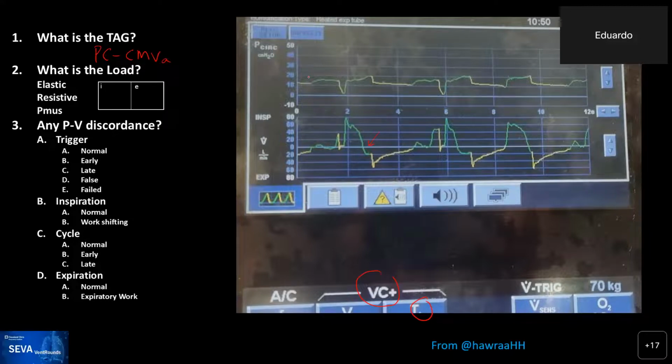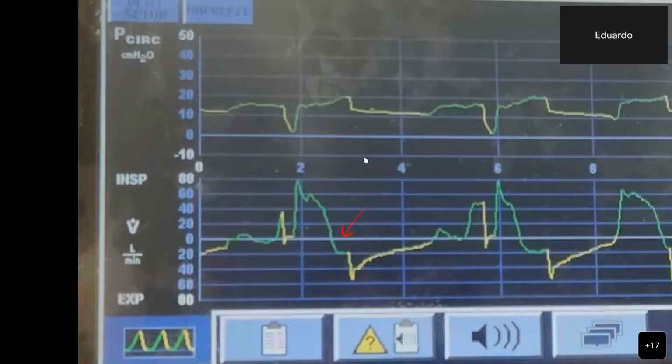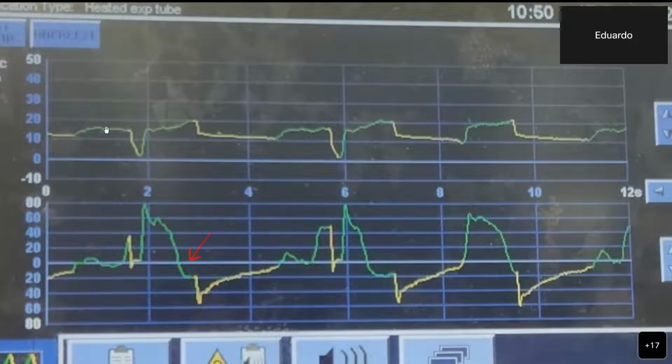And then it's adaptive. And adaptive means that the ventilator is going to achieve the target that you set for it. So you set a target of 500 or whatever number you want, and it's going to move the pressure up or down after the breath is finished to achieve the volume that you want on the next breath. And if you pay attention to this, and I'm going to amplify it for your eyes here, you can see how in the first breath, the pressure is here.